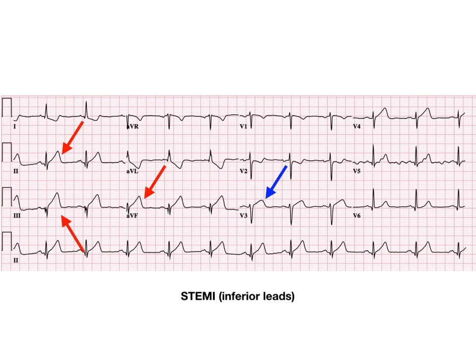That's what I'm saying here. Don't go through that methodical crap unless you're going into cardiology or you really want a mastery level understanding of ECGs. If you just want to dominate boards, do it this way. So this is a STEMI.